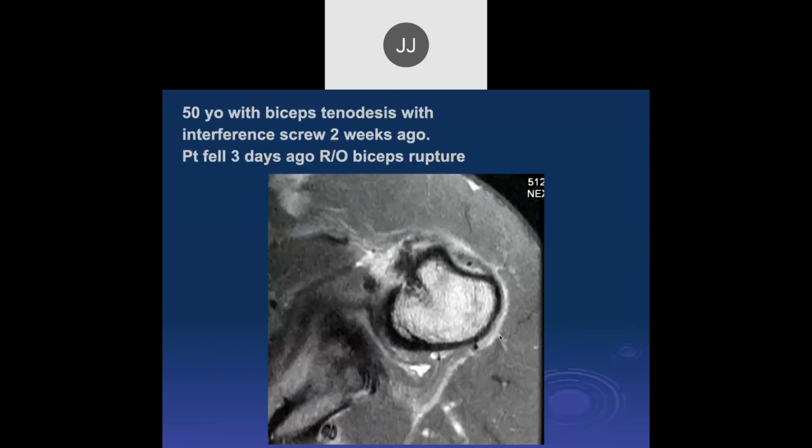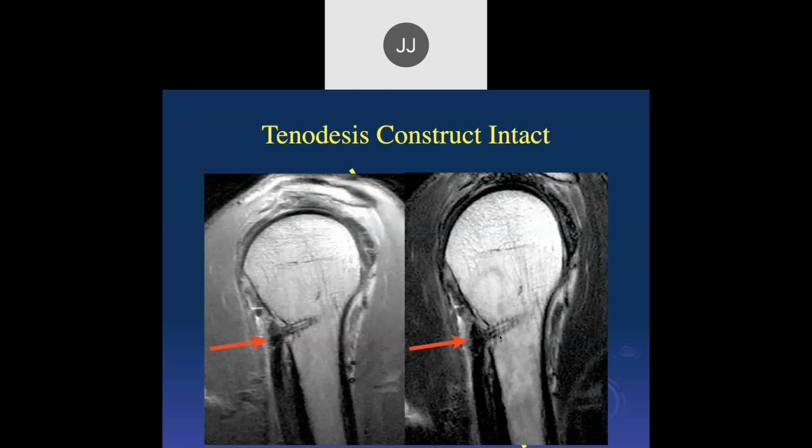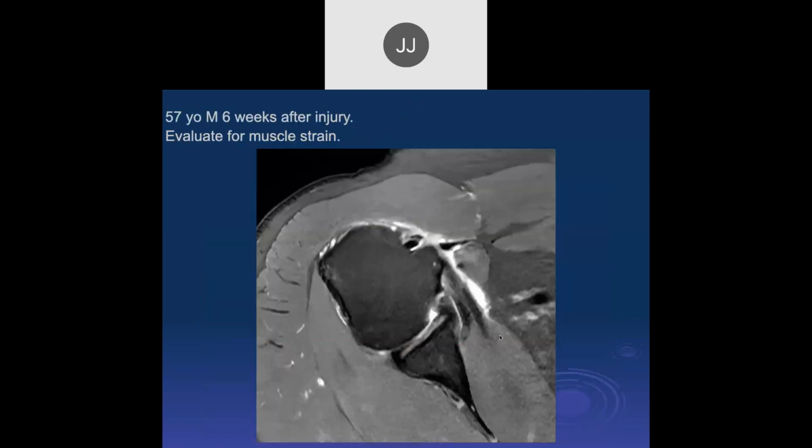Well, apparently the patient wanted. Was that a female? I don't know. Not too much muscle. That's not a female. That's a male. I usually guess pretty good, John.